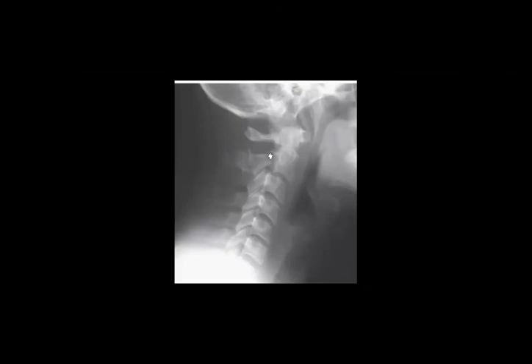So the fracture here is crossing the lamina, and you can mention that it is also crossing the pars interarticularis, and associated with what is problematic here in the alignment? Anterolisthesis. Anterolisthesis. Perfect, Nermeen. And you search for any other associated fracture, the most important.